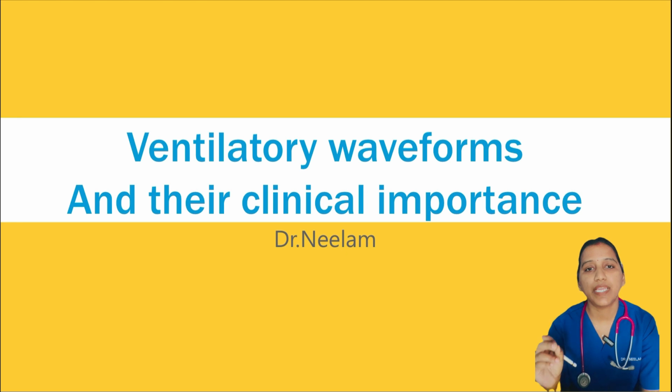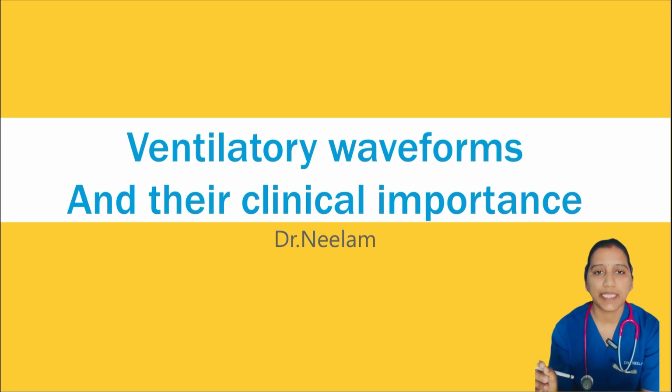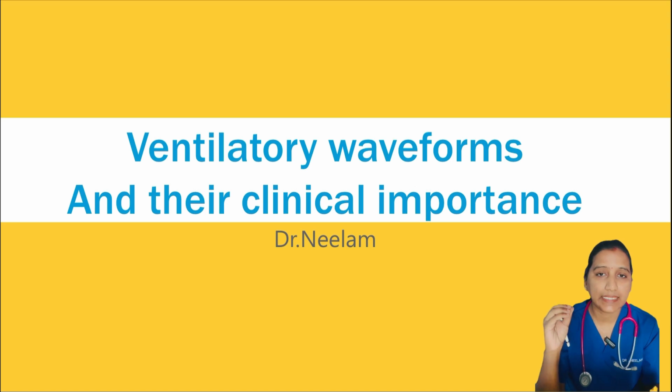In today's video, we are diving into one of the most crucial yet often overlooked aspects of mechanical ventilation, that is ventilator waveforms. Whether you're a medical student or resident, working in the ICU or emergency department, understanding these waveforms can literally change how you manage the patient in real time. We will break down each waveform and decode what they reveal about patient-ventilator interaction, lung compliance, resistance, and even life-threatening issues like auto-PEEP or patient-ventilator asynchrony. By the end of this video, you won't just see those waveforms, you will understand them.